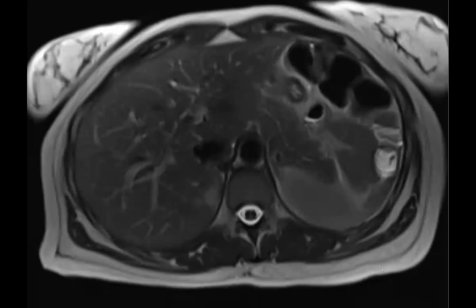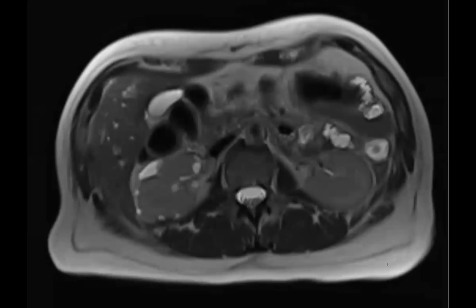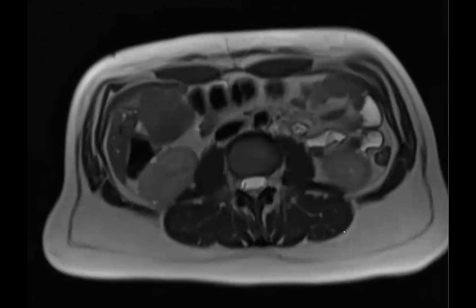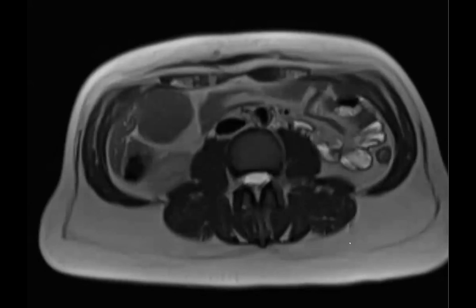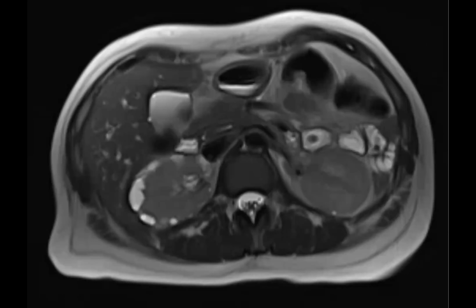Much disease. What disease? Can you go down? Can you scroll through? Yeah. No, much is actually left-sided. Okay. I don't know. I have two differentials. It looks like perinephric lymphangiomas, or there's cystic stuff around the right kidney. I have one more differential, glomerulocystic, but that should be bilateral.